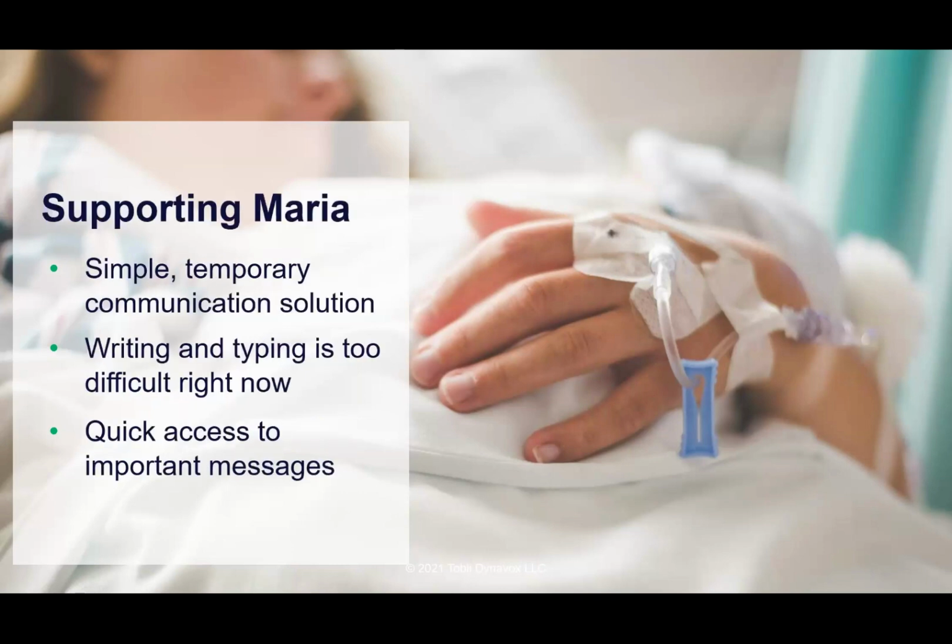At the time, while she's in the hospital, her condition makes writing difficult, and therefore typing on a keyboard is pretty exhausting for her. Maria's team in this situation suggested using TD Snap Express on a tablet. So this would give her quick access to important vocabulary and phrases with just a few selections.